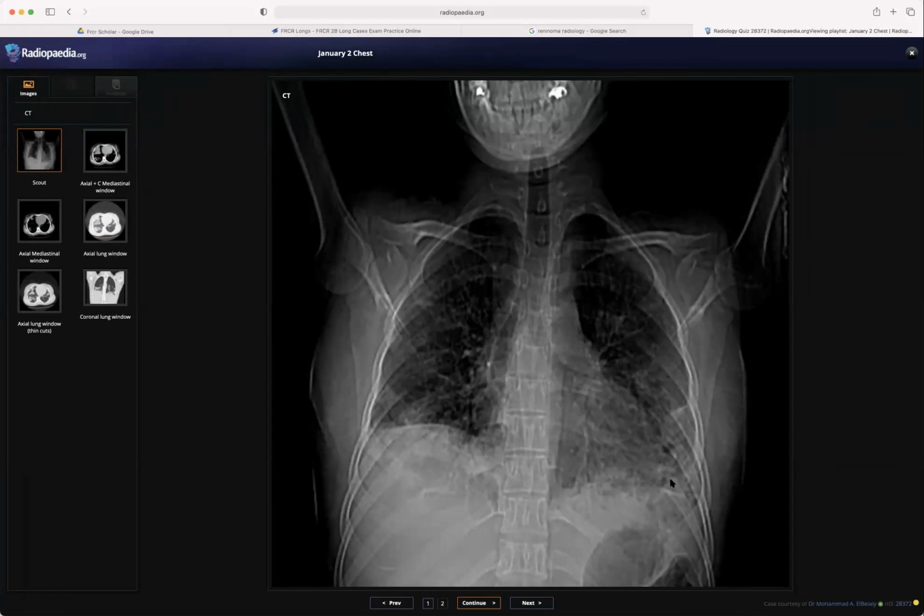I know this is not so good an image. Okay, I'm provided with a scanogram of the chest. I can see some radiodense opacities in the left lower zone, as well as a shaggy diaphragmatic contour, and some opacities are seen in the right lower zone as well.